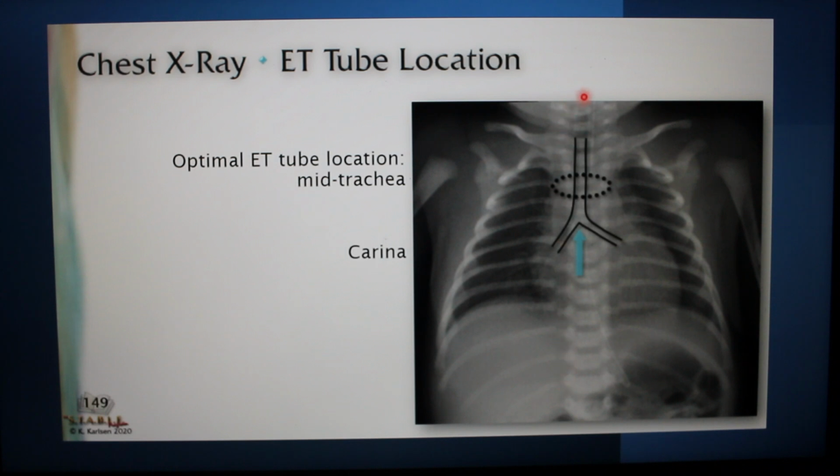So here we see, once again, the OG goes down and it's sitting right in the middle of the gastric bubble. Perfect position.